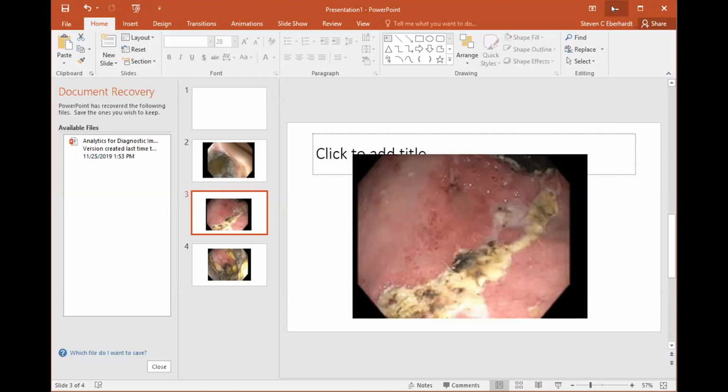So, one, did she have other signs of ischemia, like elevated lactate? Was she really sick? No, she wasn't that sick. So I think maybe the ischemic changes in the bowel wall were only mild, and the pneumatosis, like pneumatosis can be, was probably relatively benign pneumatosis, even though it was gastric wall. A lot of times we don't see a lot of pneumatosis in gastric wall, but when we see pneumatosis, it's always treat the patient, not the pneumatosis. And so that's kind of what they did here. So there were no draconian treatments required.